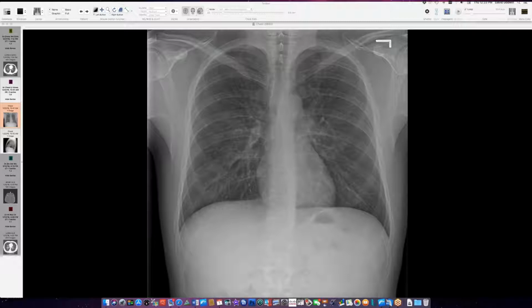So here's a roughly 40-year-old person, previously healthy, who does have a little history of sinus disease, and had a lot of joint pain, a lot of arthralgias involving bilateral shoulders and things like that, and then developed some hemoptysis. This is a chest radiograph around this time, and there's just this very subtle smudging of vessels in the mid-right lung, and then once having seen that, you wonder, could there be a little bit on the other side as well?